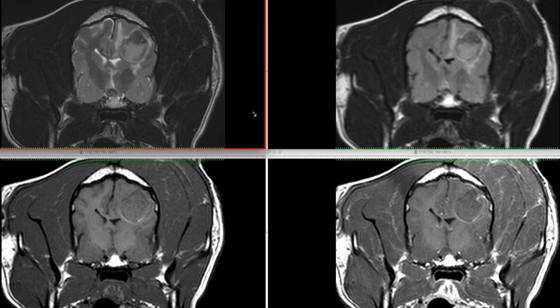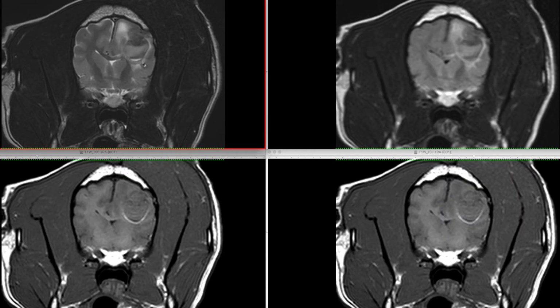One of the important things to assess on MRI is the different signal characteristics on the different sequences, which will give us a lot of information about the underlying pathology and the tissue characteristics of the lesion. In this case, we have a rather unusual appearance to this largest lesion. We can see here that we have a fluid level.